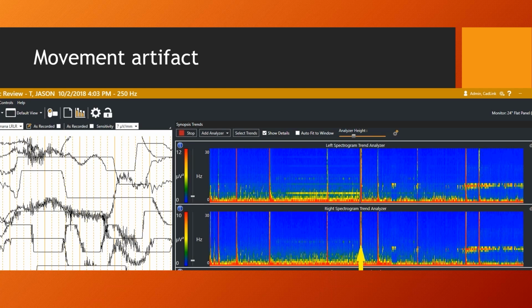In fact, this is a normal patient, so all of those things that cross the whole frequency spectrum are artifacts. This is the one where I showed you the little blips that show the sleep spindles and the activity that shows the increase in alpha power later in the record.